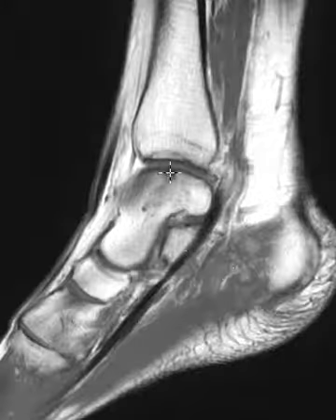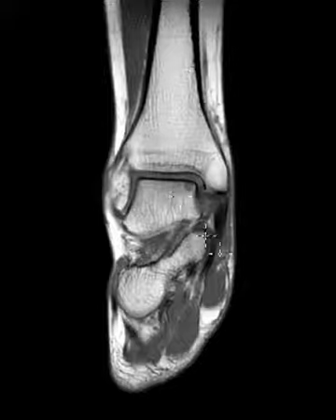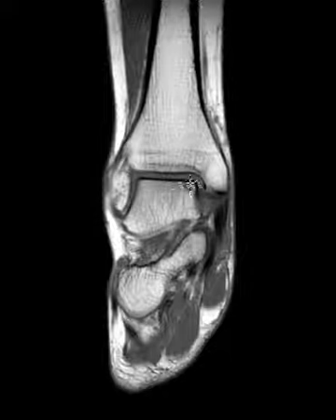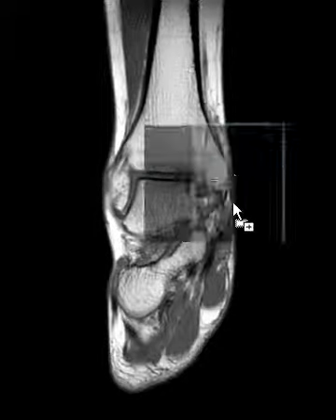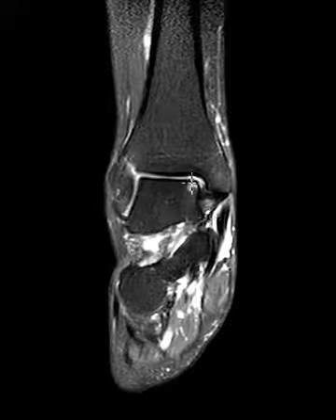Number one, there's a very tiny osteochondral defect of the medial talar dome, very, very small, barely discernible right here. It shows up best here on the fat suppressed PD sequence. You can see this little area of brightness right there. So it's an osteochondral defect.